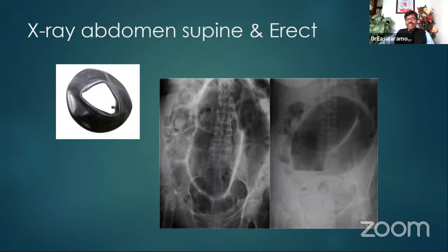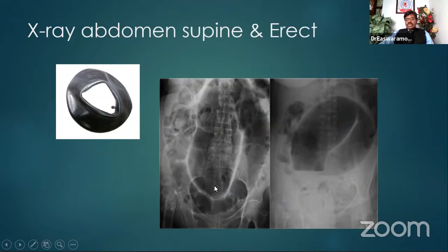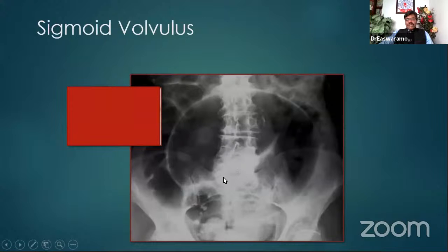The sign I am looking for is the Frimann-Dahl sign. There is a person named Frimann-Dahl, I told you. That is the Danish fellow. So actually, if you see, there are 1, 2, 3 lines, they all converge here. So this is the Frimann-Dahl. This is actually the bent inner tube sign, or this is what we call a coffee bean.